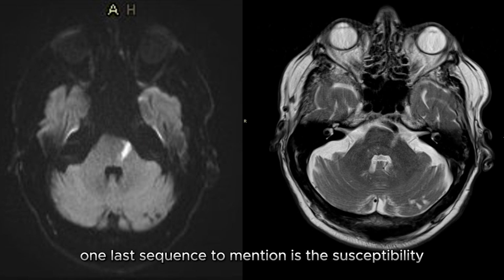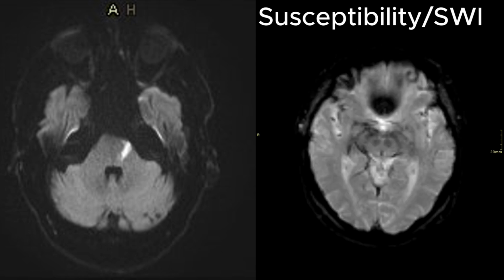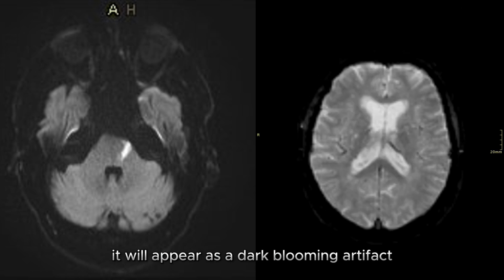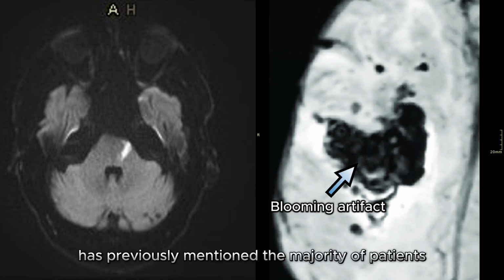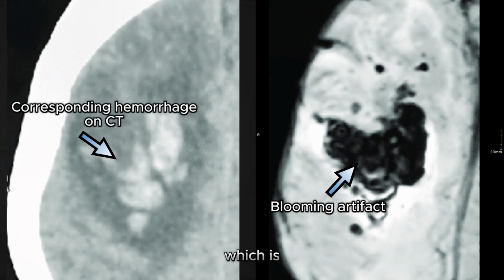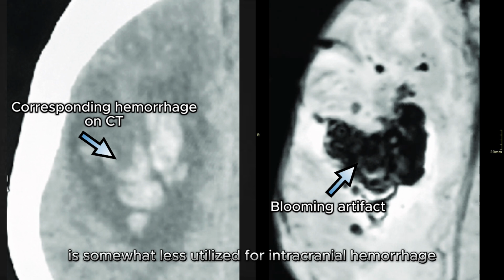One last sequence to mention is the susceptibility-sensitive sequences, or SWI. These sequences can detect blood products. They appear as a dark, blooming artifact, which can be seen with hemorrhagic blood products. As previously mentioned, the majority of patients, however, will go for a non-enhanced CT, which is robust for diagnosis of intracranial hemorrhage. So MRI is somewhat less utilized for intracranial hemorrhage in the acute setting.